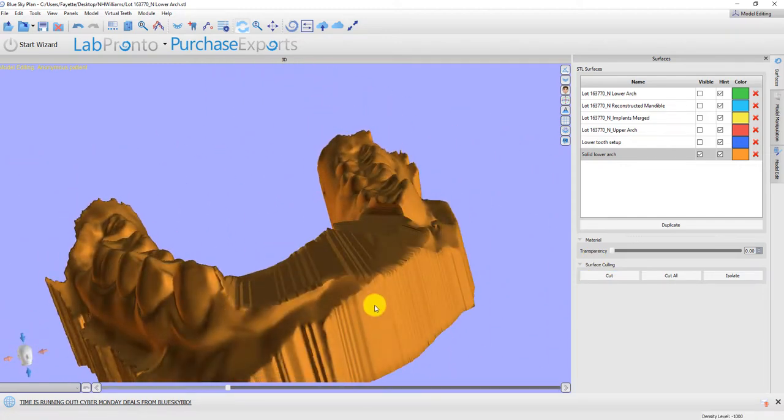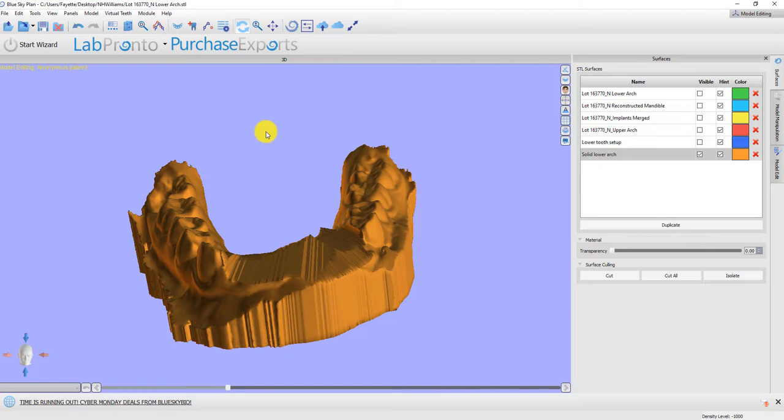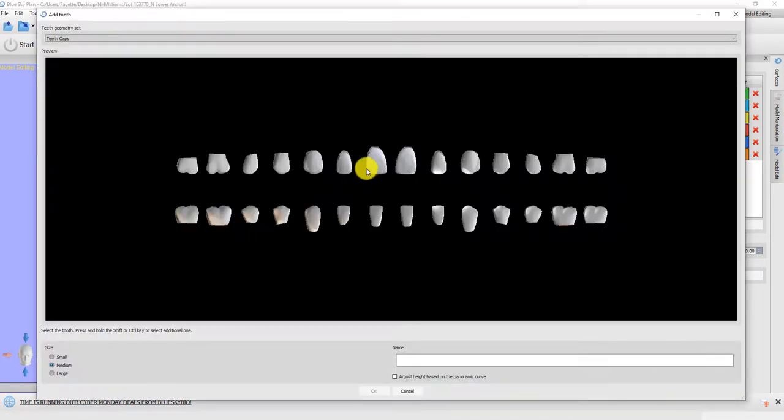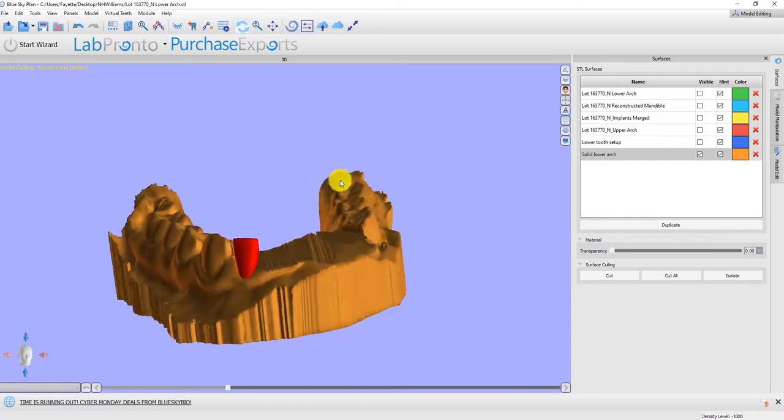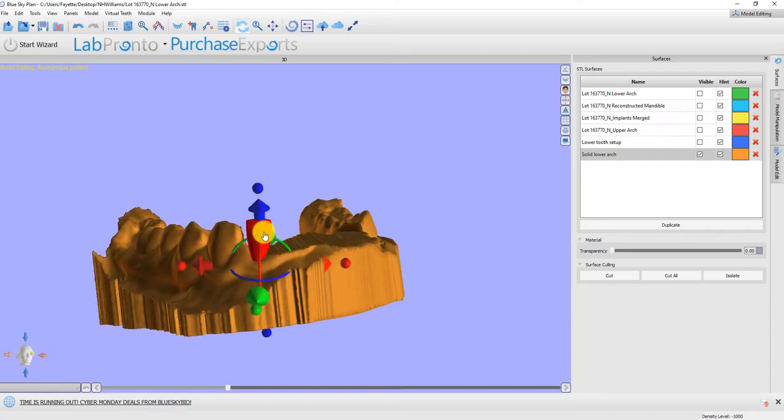And so anyway, you cut this down kind of like virtual extractions, and then I place teeth using this plus tooth, where you can take the teeth and put them in here and just do a little virtual setup. I'm going to actually remove this because I'm not going to bore you with how we do that.